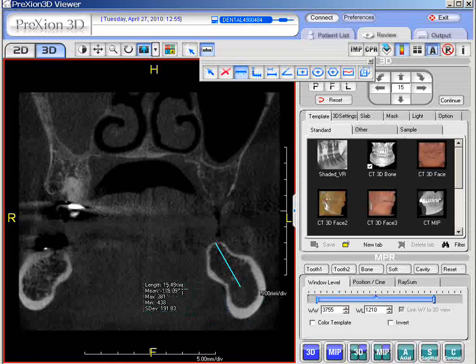If you look, the length is going to be in millimeters. Mean, max, and min are numbers that are displayed with the pixel density along the line that you have created. So that's all these bottom 3 or 4 numbers mean, standard deviation obviously. And then the top number is the most accurate in terms of what we are looking for when we activate the distance. Okay. If we left click it once, we have a dotted line that connects, and notice the box is color coded on the outer periphery as well. So we have a selection for distance and length.